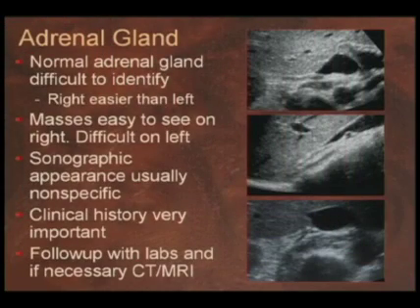Well, that does it for the kidneys. I want to just briefly review the adrenal gland. We often ignore the adrenal gland when we're doing sonography of the abdomen, and that's probably appropriate because ultrasound is certainly not a mainline test for looking at the adrenal glands.